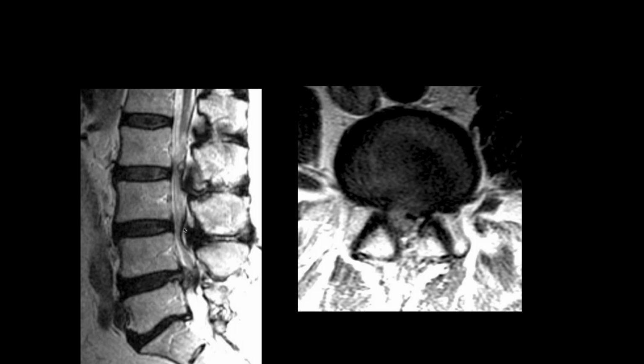Yeah. We can see that there's a lot of redundancy of the ligamentum flavum posteriorly here, so that there's narrowing really at 2-3 and at 3-4 as well from posterior disease, but then we can see the most severe narrowing is here, probably from some posterior disease, but also this focal disc extrusion here, markedly compromising the volume, the cross-sectional area of the thecal sac, and compressing the nerve roots.